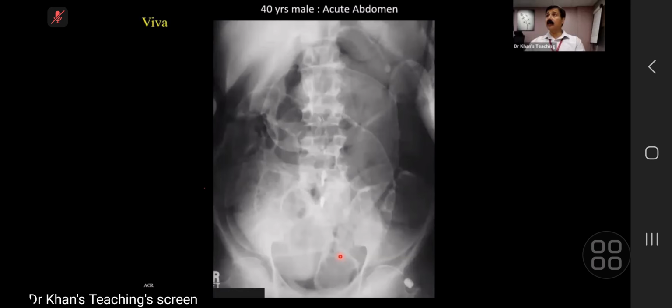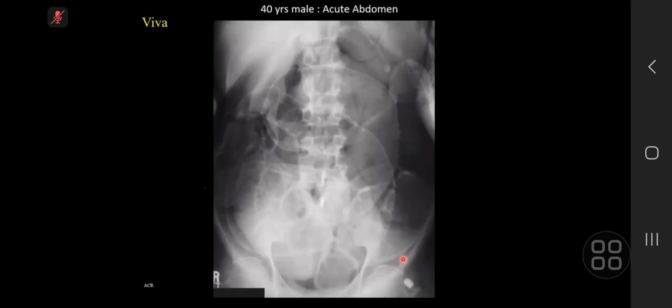This is your last case, and then number 6 should be ready. If you can tackle it as a viva film, and I'm listening to your description, please. Over to you. Okay, so this is a plain X-ray abdomen frontal view of an adult patient. I can see multiple dilated bowel loops predominantly in the center of the abdomen. In the pelvis, one of the bowel loops, I can see the wall inside and outside as well. So I'm suspecting it to be a Rigler sign and pneumoperitoneum in this one.